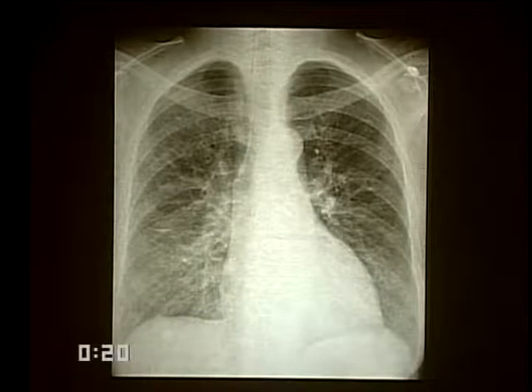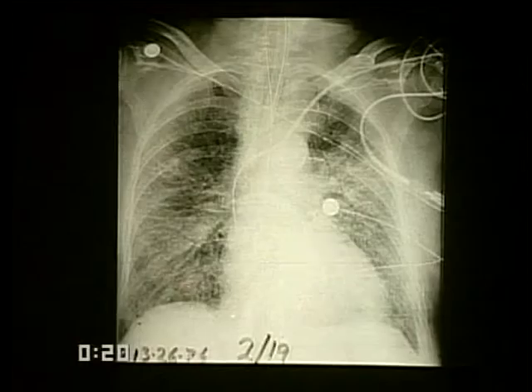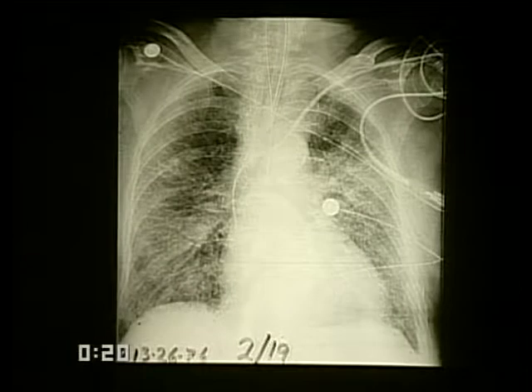entire lung are these. One is clearly congestive heart failure. In this particular case, it is involving both the cortex and medulla. It really couldn't be anything other than congestive heart failure, and at first sight, this looks exactly the same. The heart is big as it is on this one.